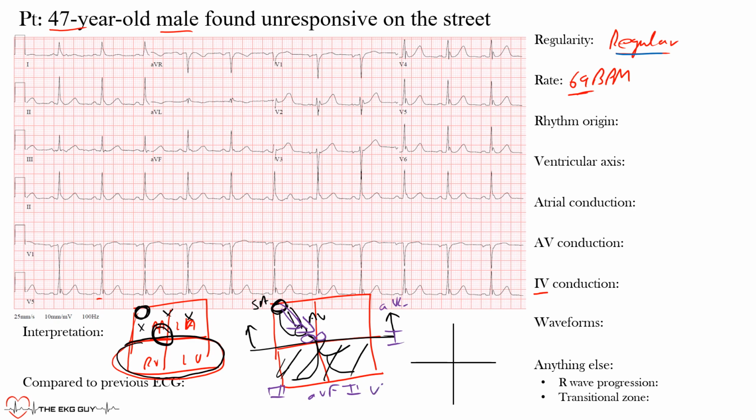Same thing for our horizontal leads V4, V5, and V6. AVR is back here. If you don't remember all this, we have over 300 lectures you can go through online to review it. I just don't want to slow down here. As conduction moves in this direction, it's going to be positive in these leads and negative in AVR in sinus rhythm.